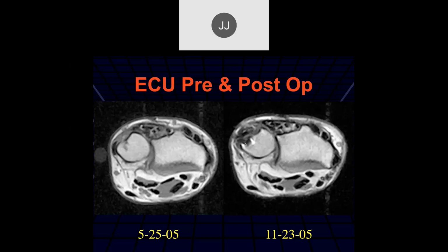Oh, okay, yeah. I'm not sure. With the other images, we could differentiate that. I'm not sure whether this is a tenodesis or whether there was a repair of the retinaculum. Well, the reason I say that is because the bone has been removed from the ulna, and you wouldn't do that if you try to fix that.